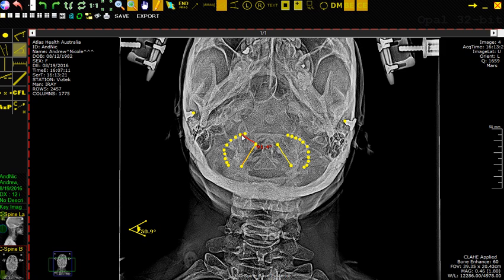But this is where it gets rather finicky, because as you can see, okay, I'm at 88.6, 89.2, that's close, but we're trying to get as precise as we can. So, okay, 89.8, that's pretty good.